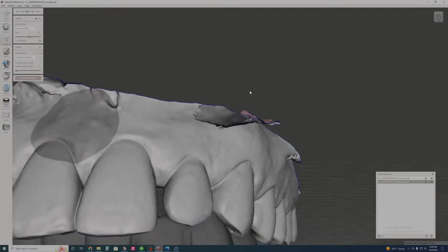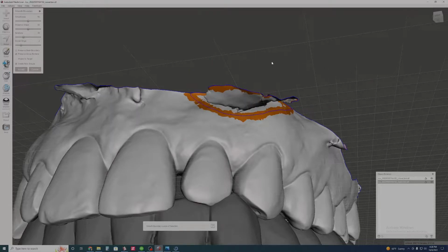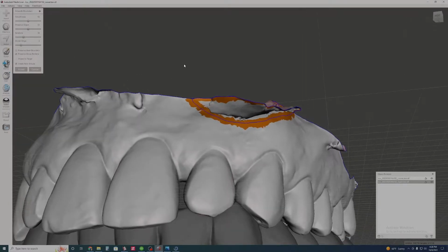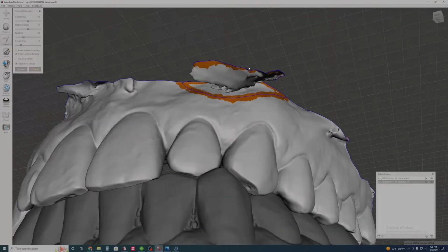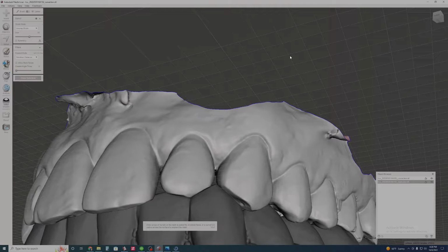I'm gonna make some selections around these areas that are just pieces of data that are just gonna get in my way. So I'm using a select tool, selecting this area, and I just hit B actually, which is a smooth tool, and enter, and it kind of makes your selection a little bit more smooth. And hit delete.